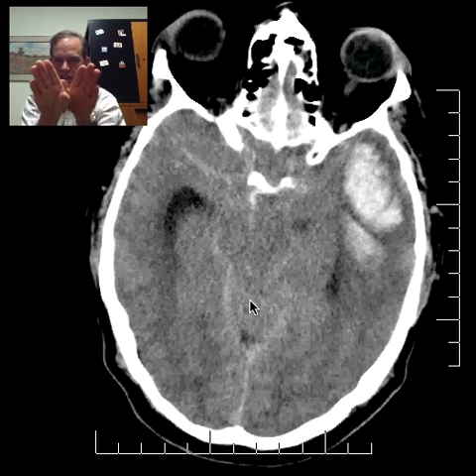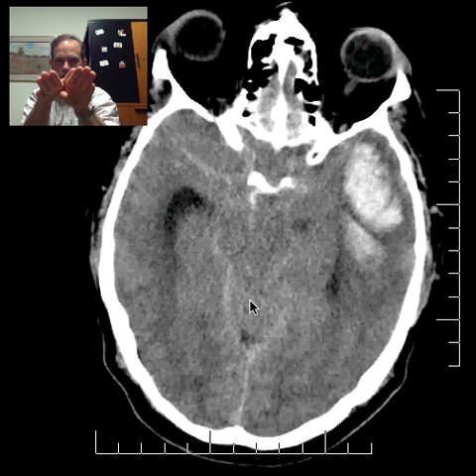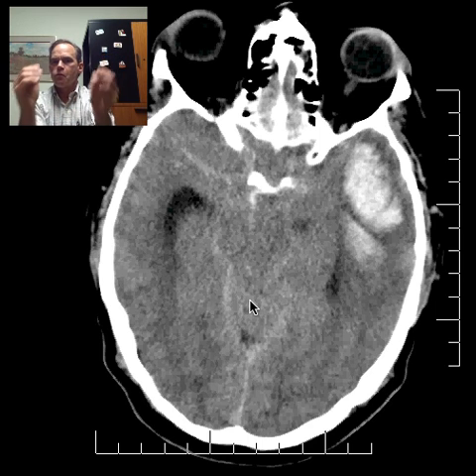It's a little notch, and that's again because the tentorium separates the cerebral hemispheres above the tentorium from the cerebellum and brainstem below. But the tent is not just this flat thing, it's shaped like a tent, and so the brainstem comes up in the posterior fossa, and then you have those two cerebral peduncles that are kind of sticking up like this, and they connect to the cerebral hemispheres.